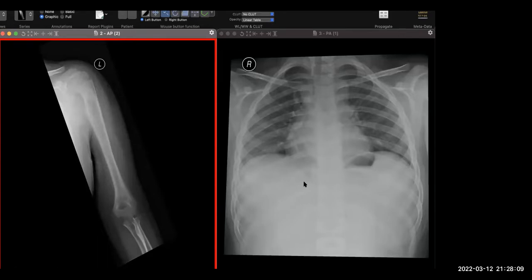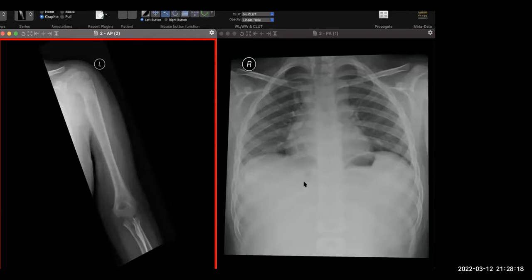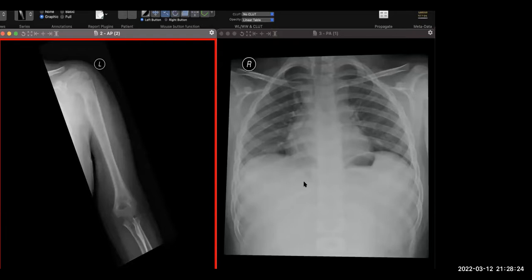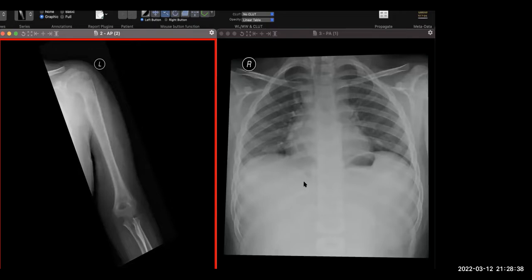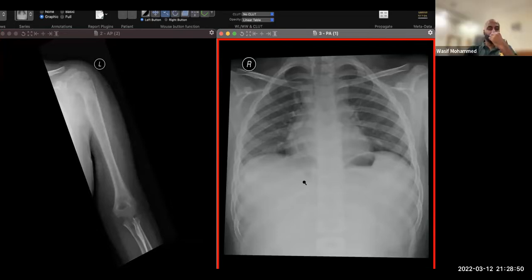So in my routine practice, I would... Does the chest X-ray help you to narrow down your differential for the bony lesion? Do you have any significant positives in the chest X-ray? Other than the mediastinal, I think I could appreciate some right paraspinal retrocardiac. That's fine. So what about mediastinal lymphadenopathy? Does that help you in any way? Yeah, mediastinal lymphadenopathy with the symptoms could favor an ongoing infectious etiology in the patient. Infectious etiology. The patient, like I said, does not have any fever.